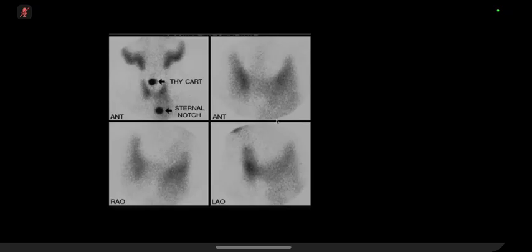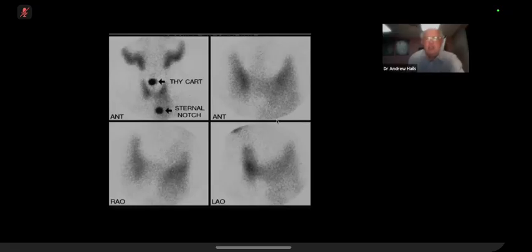the right lobe. Yeah, so basically what's happened is the patient had the chest x-ray you saw. They may well have had some other, say, ultrasound or CT imaging, and people think there's something disappearing down into the chest. They may have done a CT and found an anterior mediastinal mass. And then the question is, is this anterior mediastinal mass, say, lymphoma or something, or is it a retrosternal thyroid?